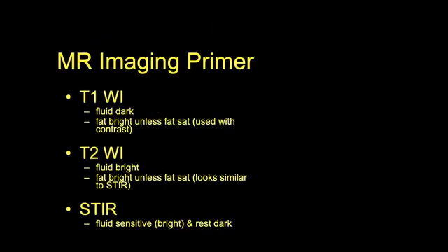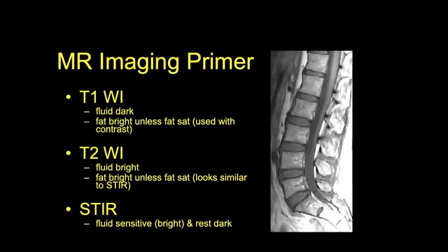In terms of our MRI sequences that we typically use for spine imaging, it's often our routine T1, T2, and you should always have a fluid-sensitive sequence such as inversion recovery, STIR, or T2 FAT-SAT. Again, the STIR is to pick up a bright signal that may be related to things like infection, fracture, or neoplasm, but can also be helpful in some degenerative conditions, as we'll talk about.